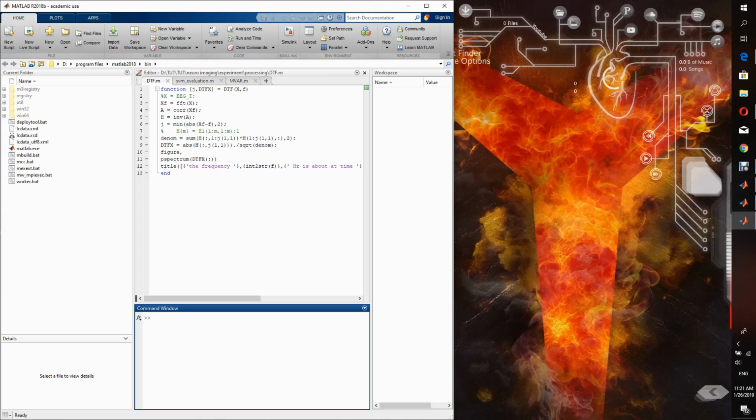My application doesn't use the calculation power of the GPU, so the inverse part of the calculation, especially the leadfield, is not included in my application.